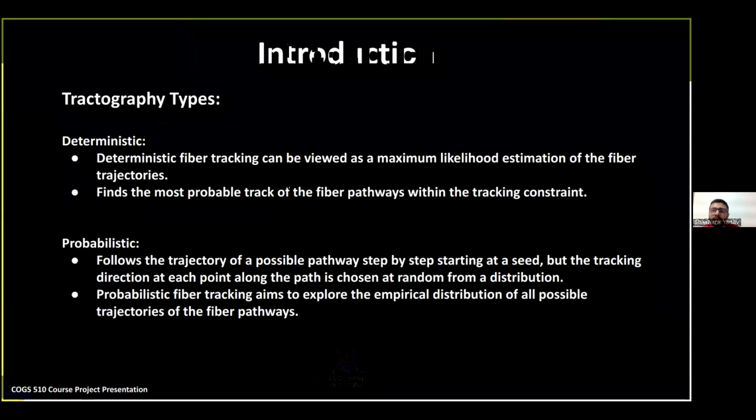The other one is probabilistic, and when the tracking starts, it samples the tracking direction from a distribution. In my opinion, there's no one method better than the other; it's more of a case-to-case basis, which tractography method you want to go with.